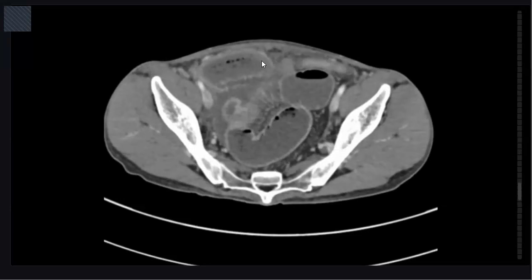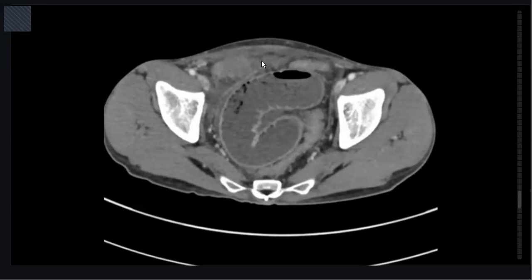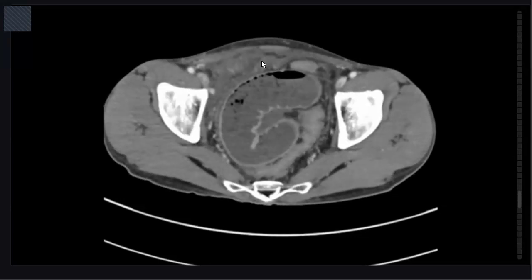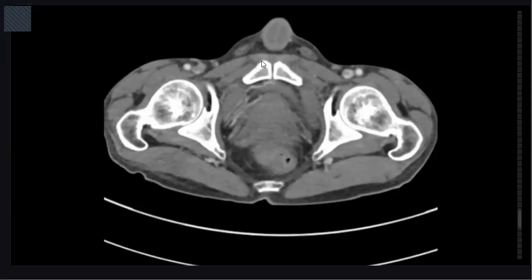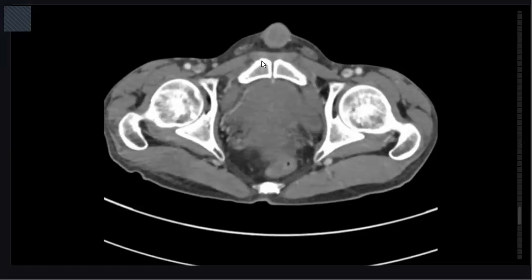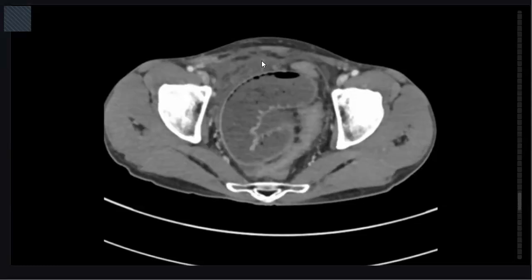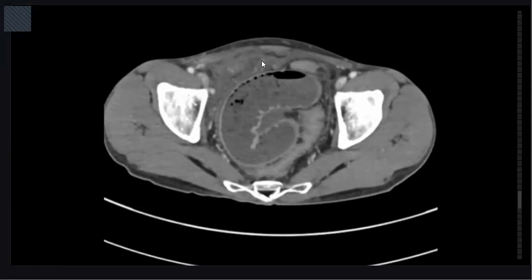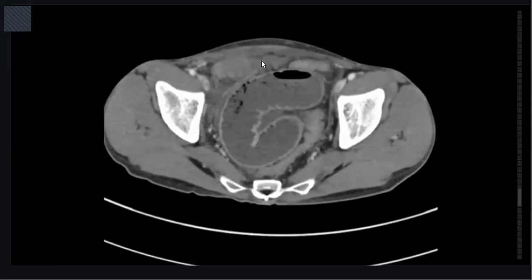So I'm searching for a possible area of intestinal obstruction at this region. And yes, here I can also see pneumatosis in the wall of the small bowel at this area. It can be seen on the anterior wall; in the posterior wall, I couldn't detect it clearly. Yes, it is in the lower wall.